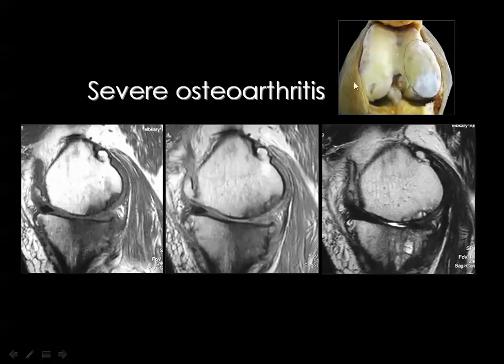And here you can see an arthroscopic picture or cadaveric picture where you can appreciate what we mean by degeneration of the cartilage, or the commonly written word in the report, denudation of the articular cartilage. Denudation meaning that the cartilage is totally degenerated with loss of its normal thickness, loss of the water content, ulcerated surfaces, and these ulcers may reach the underlying bone.